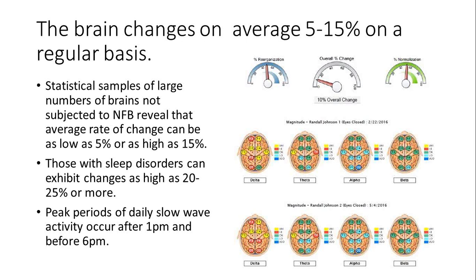Okay, so this sounds a little complicated. It is a little bit, and you can really get into the complexity statistically of it. But you can keep it simple for yourself by just remembering to try to map at the same time on your pre-map and post-map with each client. And I would recommend before 1 o'clock, because our research shows that you get a lot more variance in the afternoon and a lot more slowing, and it really distorts the map.